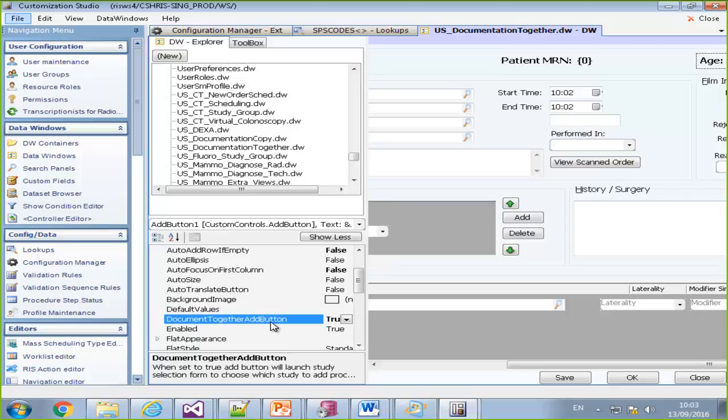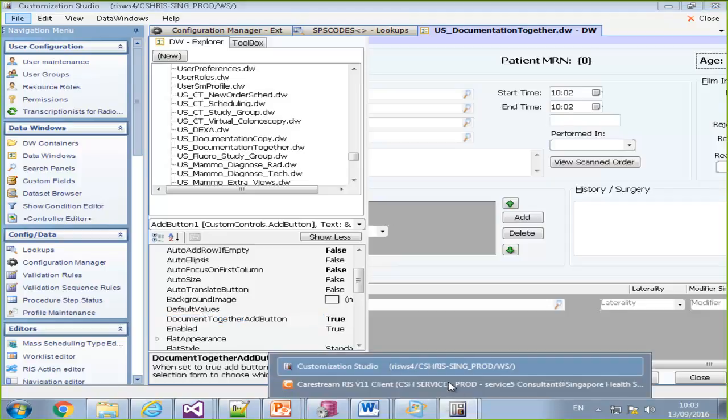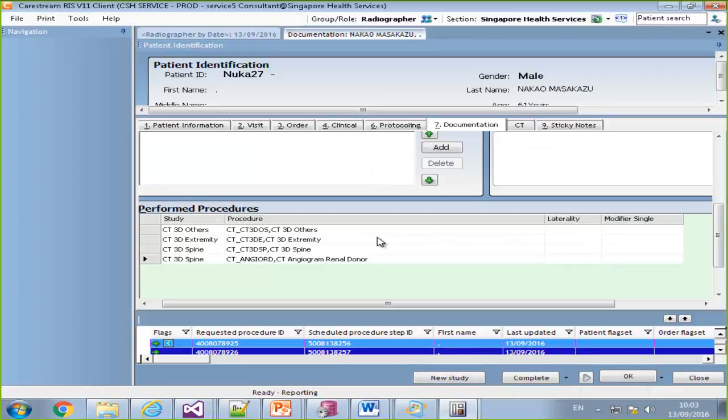It has no real meaning to set this flag on a grid that is not the PPS item. It's all relevant when the linked grid is the PPS item. But that's a specific logic. And now let's see that it works.